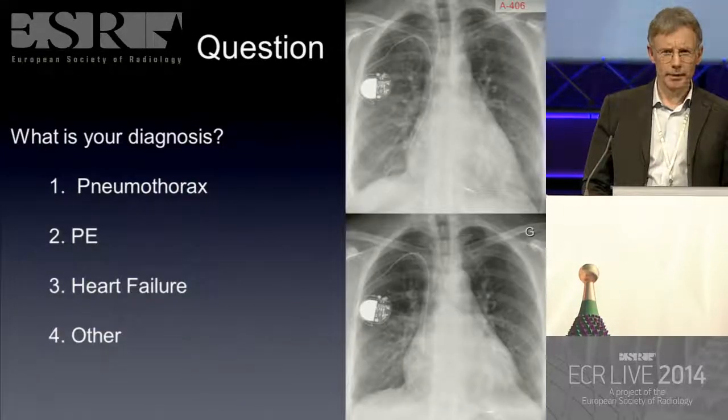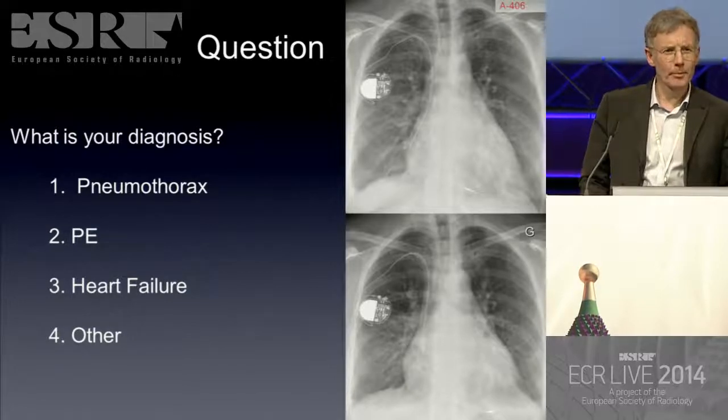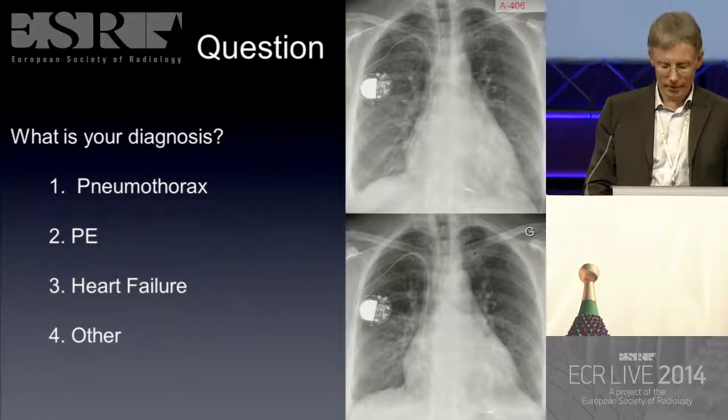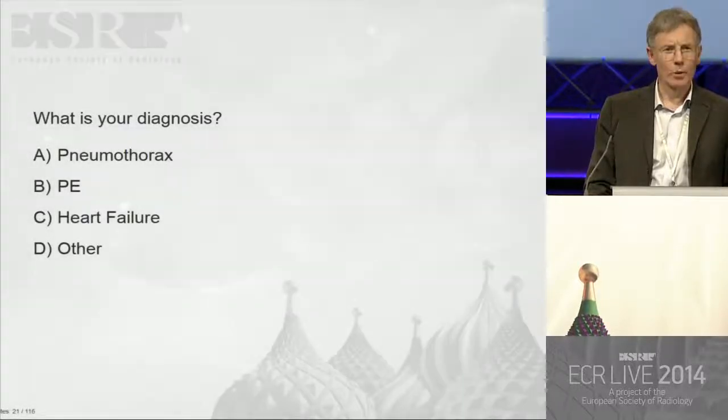But what is your diagnosis? Pneumothorax, pulmonary embolism, heart failure, or other? The answer is on the film. Day 1, no symptoms. Day 2, chest pain. Please vote now.